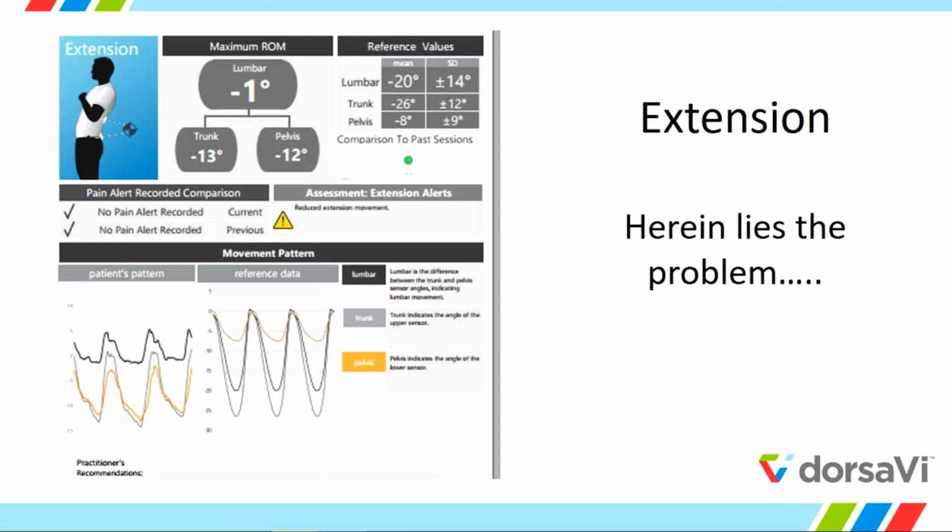And the thing is, when you see those graphs looking so jagged, you think, what is his muscle activity like? He's already in a high resting tone and he's just compressing and compressing into it. He cannot really go into extension, this person. And if you could actually see his video, you'll see him swaying a lot.